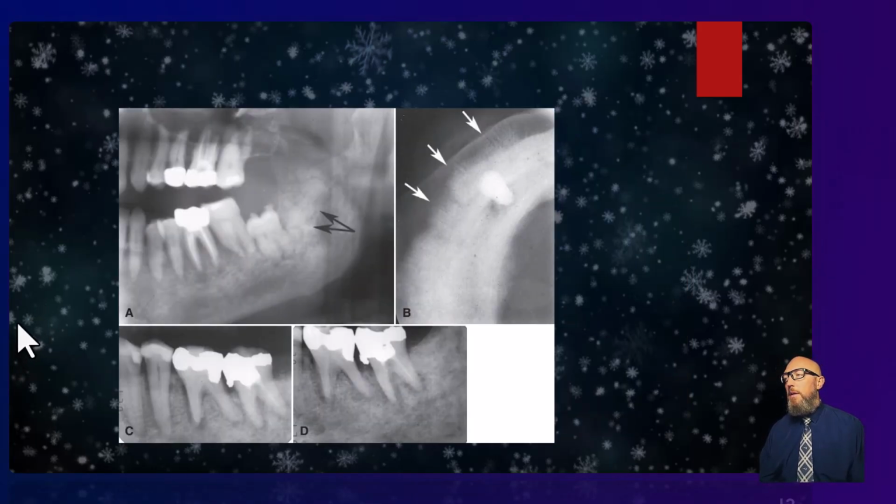All right, now here's our final suspect. Different images, but they're all kind of showing the same thing. And what are we seeing? Kind of that cotton wool appearance. We just finished talking about Paget's, so is this just Paget's? Remember we said Paget's typically more extensive through the jaw. What is the key sign that I see outlining the teeth here? And that's that kind of halo of radiolucency around the teeth.